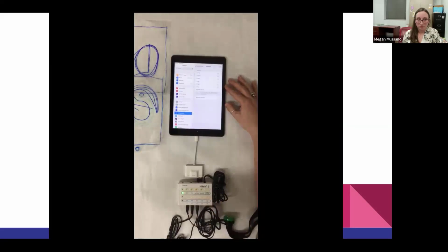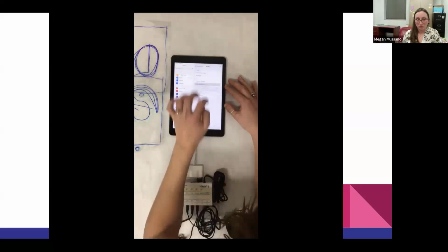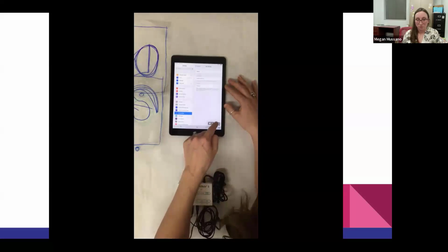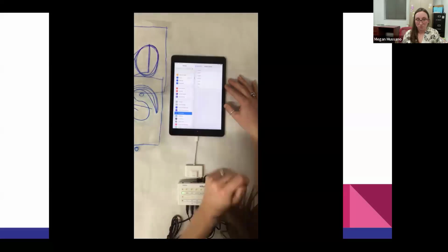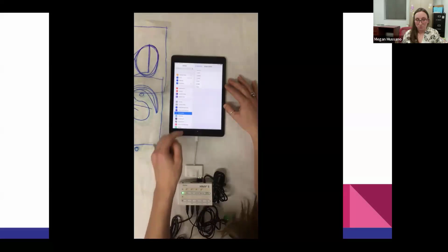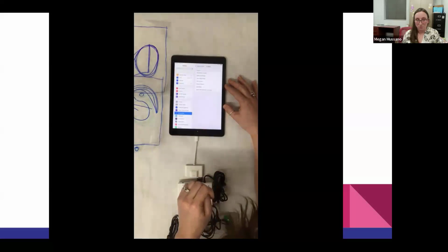Right now I have the 6 switches entered for the Hitch 2, and I am going to go and create a recipe. This is going to be a new recipe. I'm going to name it Makeup, just so it makes sense to me. And then we are going to assign switches. The first set I'm going to do is just the green row because it's on top of my Hitch 2. So the green space, I'm going to make that number 1.